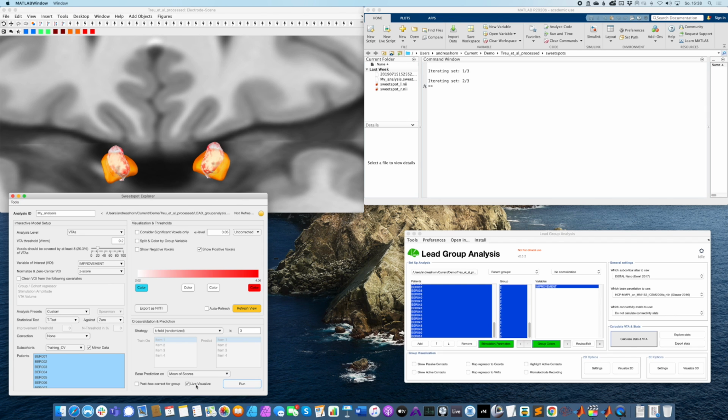Now we have the second set, now it looks slightly different. And so the degree of how much it will change could help you to understand, does this model seem to be robust? It's a bit similar to if we would take a split half design, and that would be a 2-fold cross-validation. We train the model on the first half, and we also train it on the second half, and we just look at how stable that is, right?